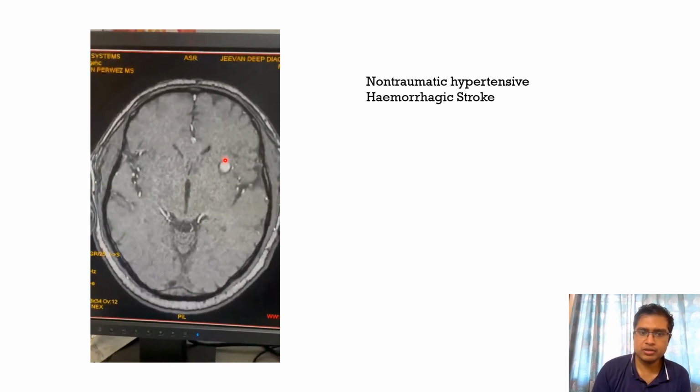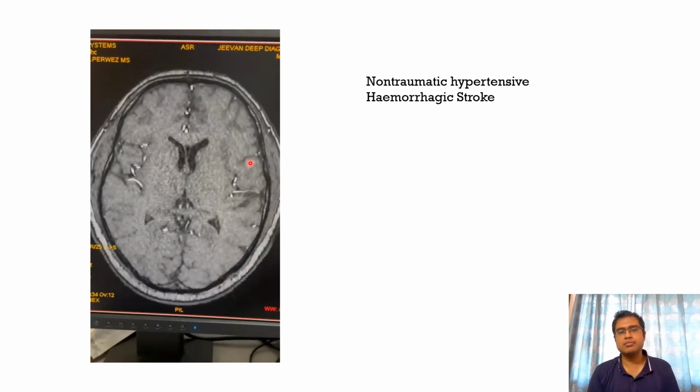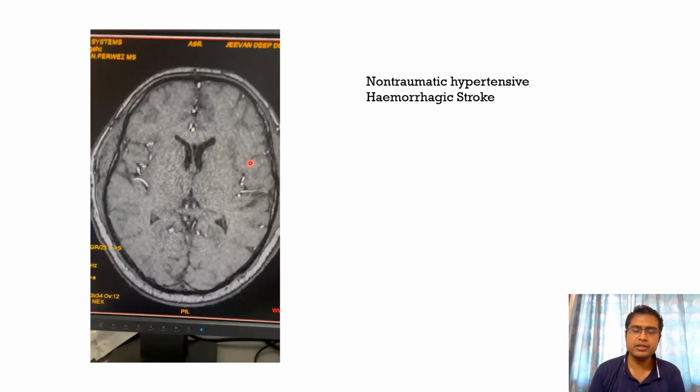This was not an aneurysm. He saw the 3D angiography images and thought that there is some outpouching of the middle cerebral artery, but as such there is no outpouching. It is just the intraparenchymal hemorrhage adjacent to the artery that is seen on the 3D images.